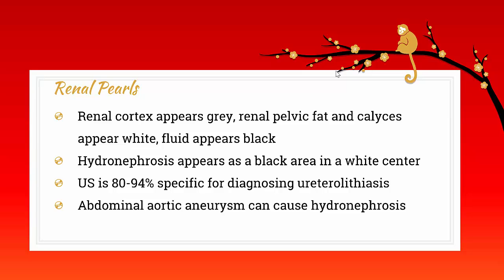Next, let's go on and discuss renal ultrasound. Renal ultrasound is going to be most useful to look for hydronephrosis in patients with a possible kidney stone or urinary retention. When viewing the kidney on ultrasound, the cortex will appear as gray, surrounding the white renal pelvic fat and calyces. As usual, fluid will appear black.